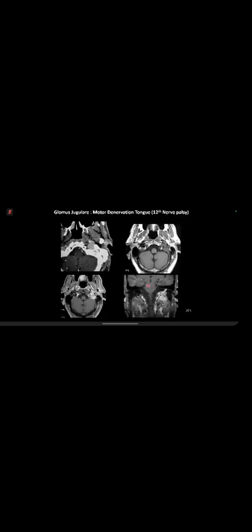So this is pharyngeal mucosal space, motor denervation of the hypoglossal nerve. And please remember that this has come in the exam, and expect it. In this particular case, you can see changes in the T1. There is low signal here, STIR slightly high signal, patchy enhancement. In motor denervation, they will show you a case where the tongue will be visible.